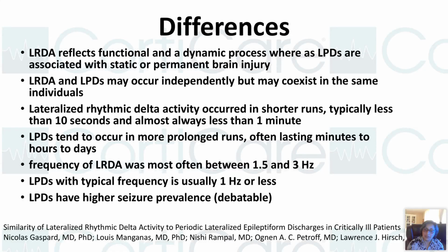Still, it is debatable if LPDs have higher seizure prevalence, but in the studies that I have put this presentation together from, there is not much difference. Even if there is a little bit more prevalence with LPDs, it is not significant.